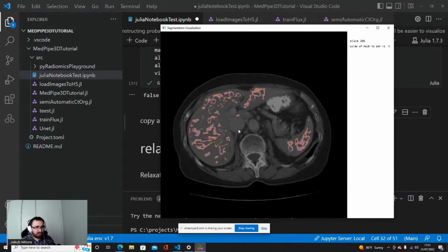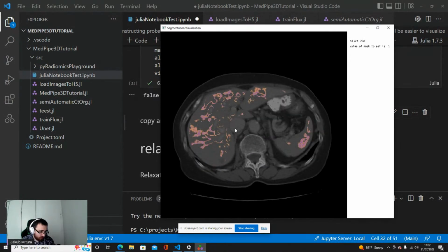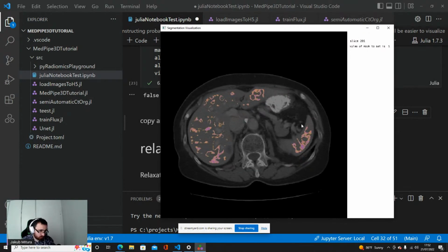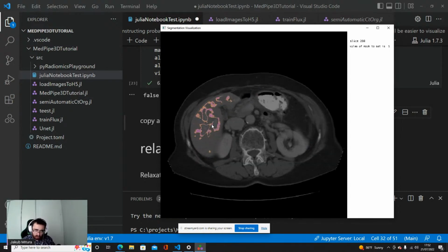You should see something similar. Basically, whether you get the spleen or liver, it should look similar, because frankly, as you see, both spleen and liver have very similar local properties. So you get these points of high probability all around the spleen and liver. So spleen is here, liver is here. This is the vertebral column, for example. If you have some questions about the anatomy, of course, you can also ask.